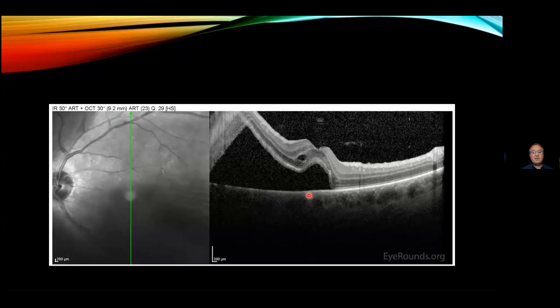So again, another slide of a patient with a retinal detachment, macula off. And then often I'm asked, you know, how important is a referral of a retinal detachment? Could you wait a day? Could you wait 2 days? Could you wait a week or whatever?